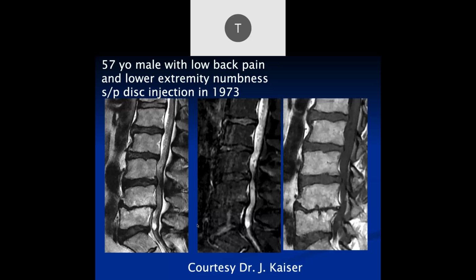A lot of remodeling of the articular surfaces. See this kind of low signal within the spinal canal there. Yeah, what's all that stuff? It's a little central stenosis there. Yeah. Okay. Notice kind of the edge along here.